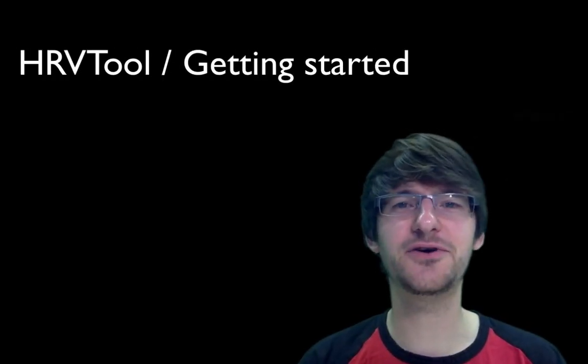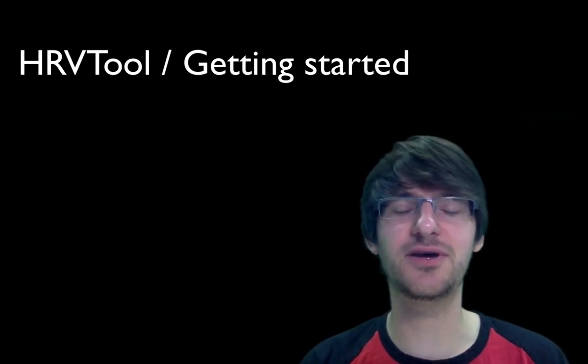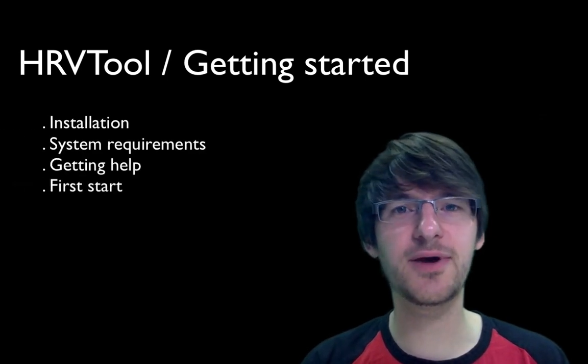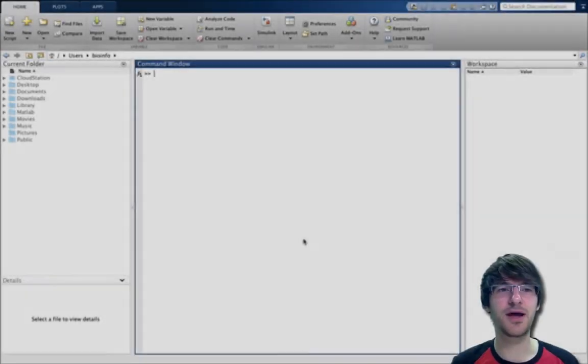Hi, my name is Markus Vollmer, and in this tutorial you will learn how to install HRVTool, the toolbox for analyzing heart rate variability in Matlab. You will learn about the system requirements, how to get help, and we will start HRVTool for the first time. So let's get started and open Matlab.